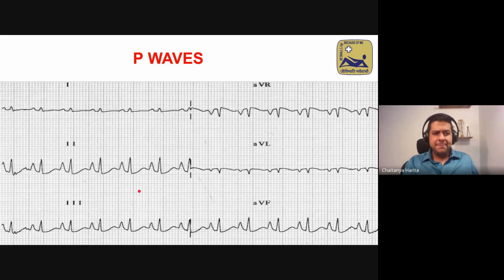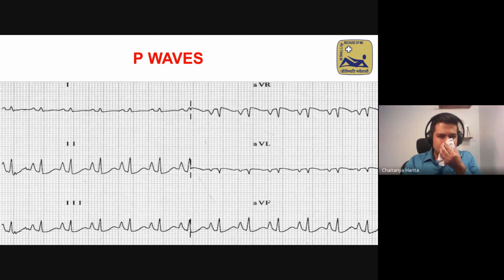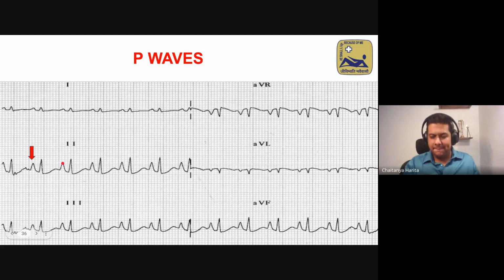So coming to the ECG that I have shown you in this particular figure, look at the ECG. First, look at the calibration. I don't think the calibration is mentioned, but let's assume that the calibration is normal in this case. Look at the P wave. The P wave looks stretched upward. It is about 3 boxes in height, which is more than it's normally supposed to be. This indicates right atrial enlargement.